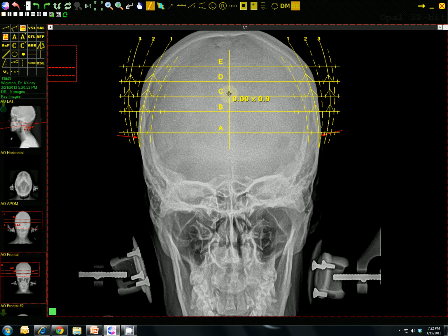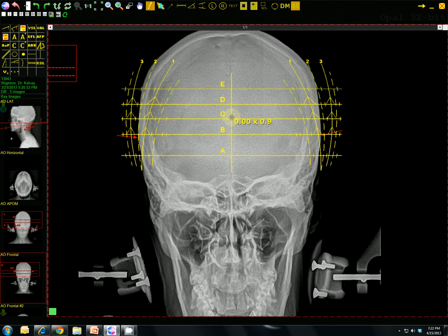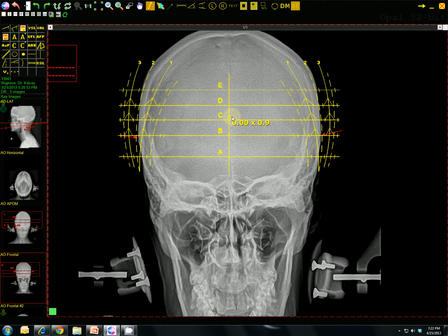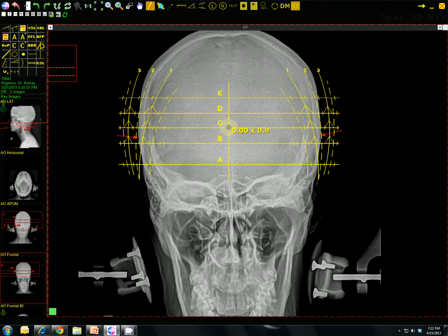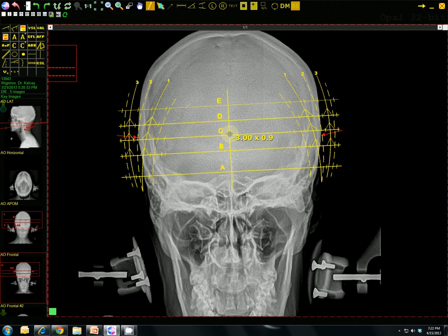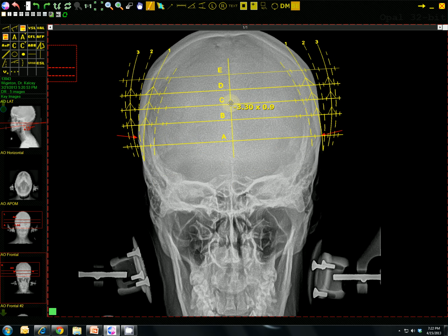and if I wanted to, I can go ahead and do the zoning procedure, and the secondary zones of the B through E, those should correlate with my findings of the AB zone. So now we'll go ahead and bring it down just to verify. So again, it's symmetrical.